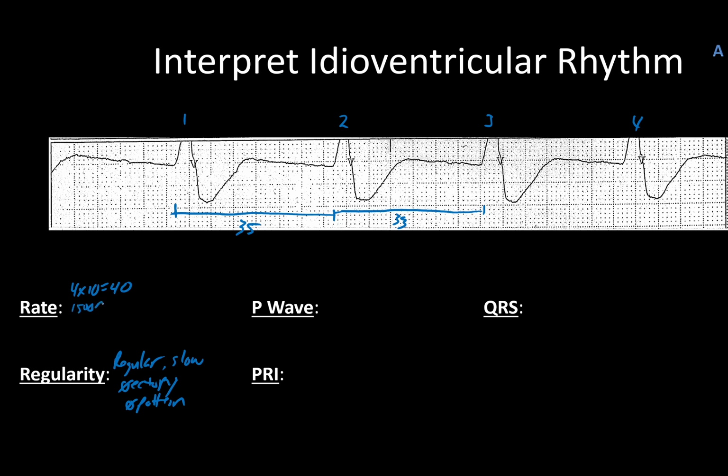That's one of the things about these slow rhythms, they can be a little more variable in this regard, but ultimately it doesn't change things by much, because you'll see our heart rates are 43 and 45, so not making a big difference. And I'll just say this right now, they're bradycardic.